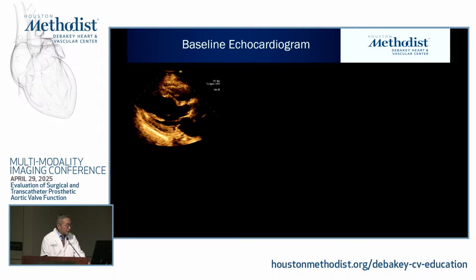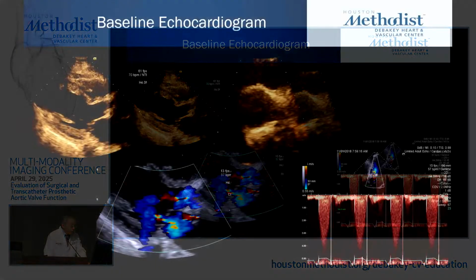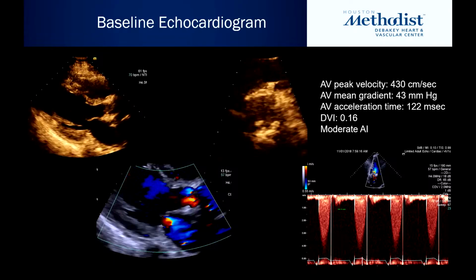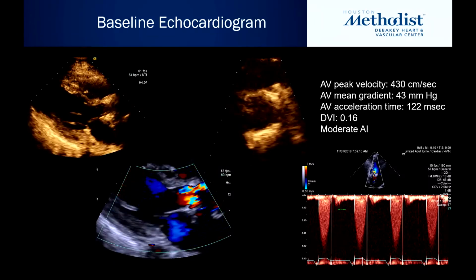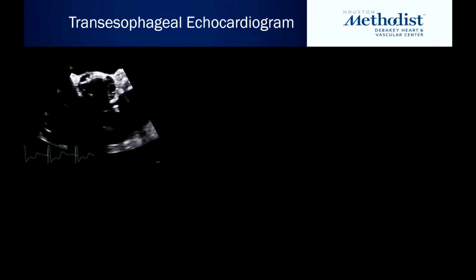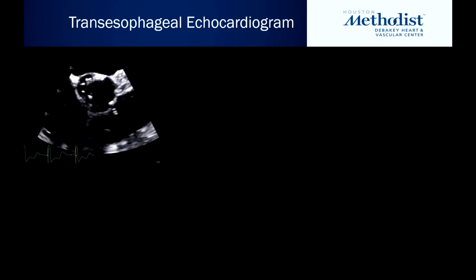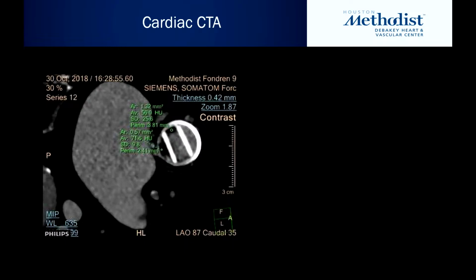So I'll start with one case. This is Dr. Little's patient. The patient came in with, I think, heart failure symptoms and clear obstruction. TEE was performed. So we know the patient has obstruction, but the etiology is unknown.